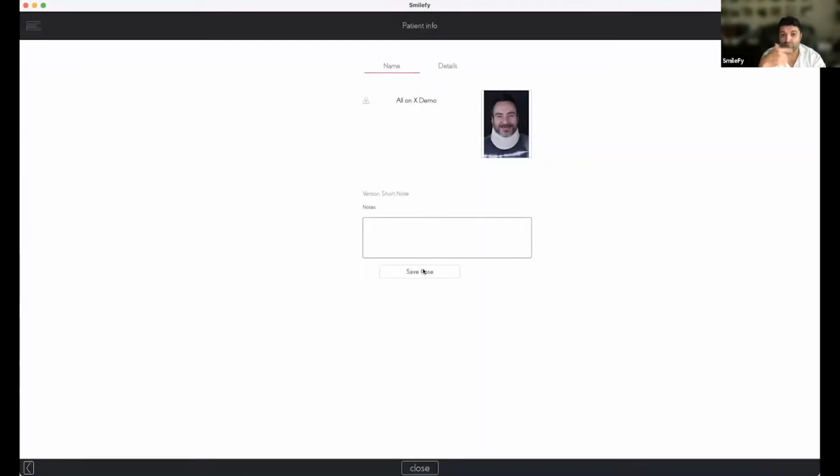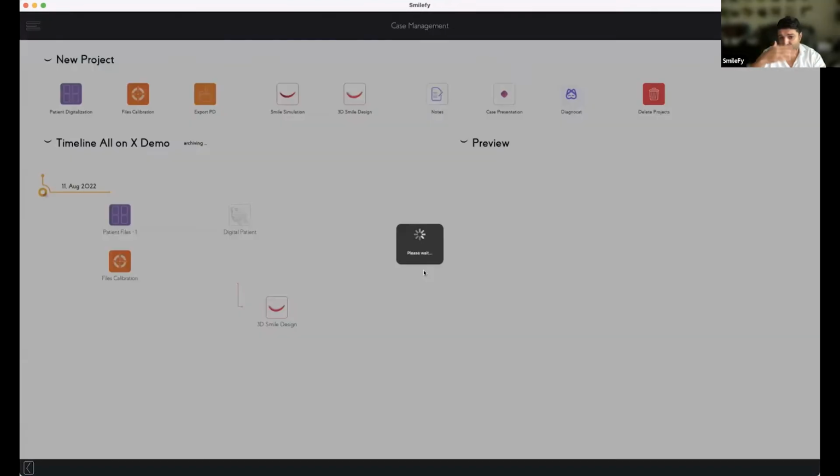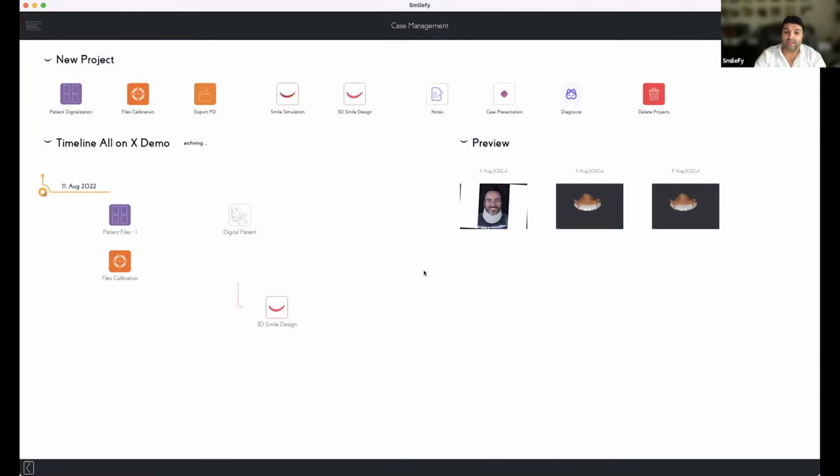That's super easy, because if we generate the lower smile based on the upper design, it's going to be generated and in position and in occlusion and in function automatically. And then we do have the next step of the design, the next step of the thinking of the treatment plan, and so on. Of course, when you bring the DICOM files, when you bring the implant position, the post-op files, then we can do more precise planning and adjusting the design.